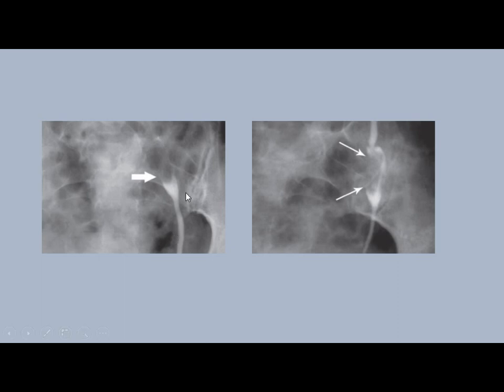If you see, this is another type of contrast study, which is retrograde pyelography, in which there is a filling defect here. This is the ureter because the contrast passes here upward, outlining the soft tissue mass, and after further contrast, there is delineation of the soft tissue mass surrounded by this contrast. This is what they call the champagne glass. It looks like a glass of champagne.